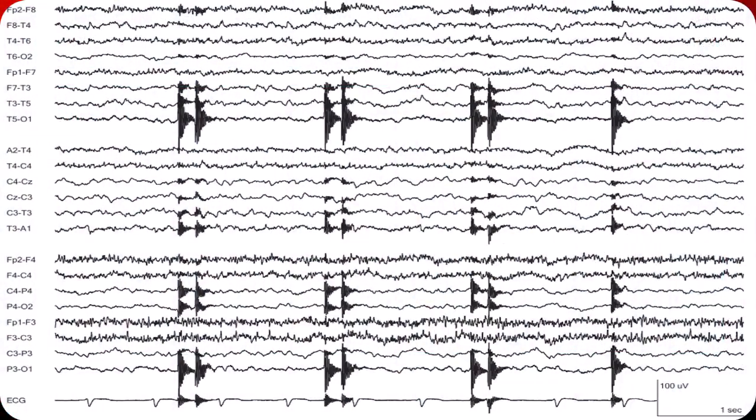Here, the EEG shows very high-frequency bursts with a fixed waveform and repetition pattern. These features suggest an environmental device rather than cerebral activity. The presence of the artifact in the ECG channel further supports a non-cerebral source. This type of pattern is important because it can look sharp and potentially epileptiform, but the repeated identical morphology and timing point toward an electrical motor such as a pump. The clinical lesson is to correlate the EEG pattern with equipment operating near the patient.